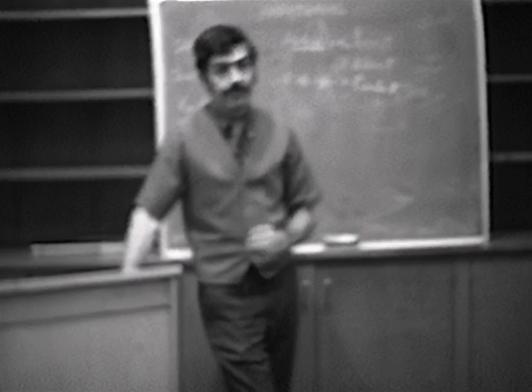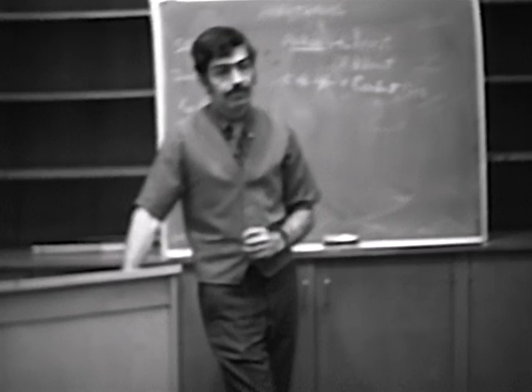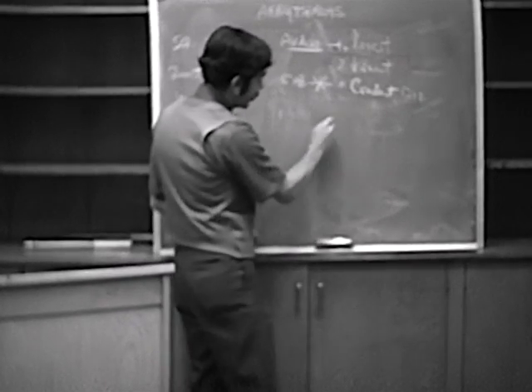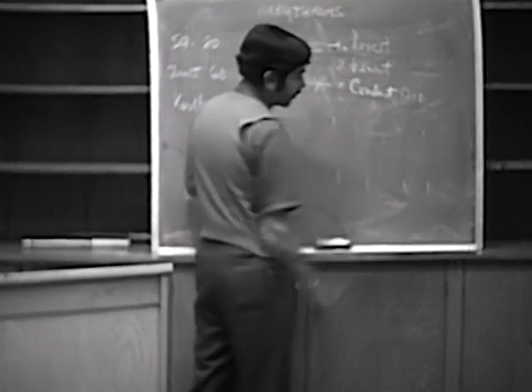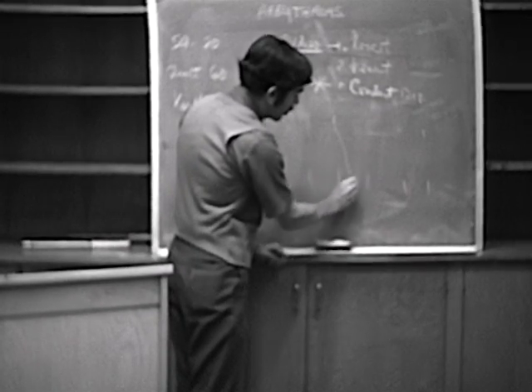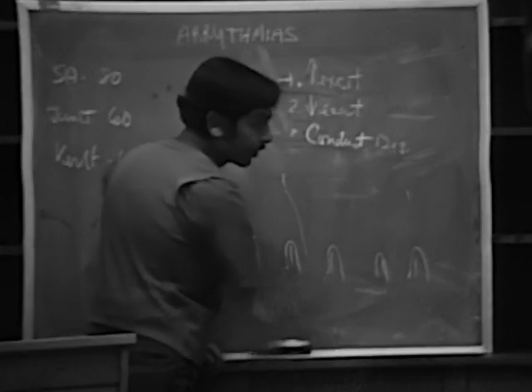The presence of what kind of beats? Capture beats. So they come through from above. You have the atria going along at one rate, and you have the ventricles going along much faster. Right? So this would be, say, a ventricular tachycardia. But every now and then, you can see, this would be a wide QRS complex, being a ventricular tachycardia.